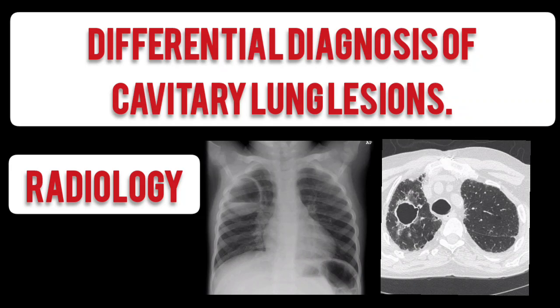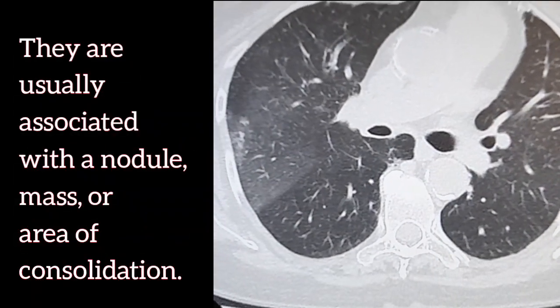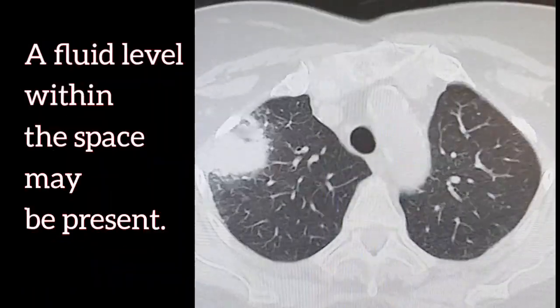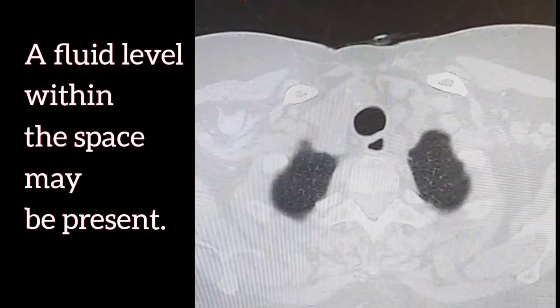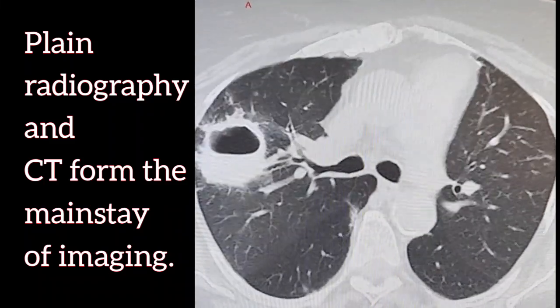Pulmonary cavities. Pulmonary cavities are thick-walled abnormal gas-filled spaces within the lung. They are usually associated with a nodule, mass, or area of consolidation. A fluid level within the space may be present. Plain radiography and CT form the mainstay of imaging.